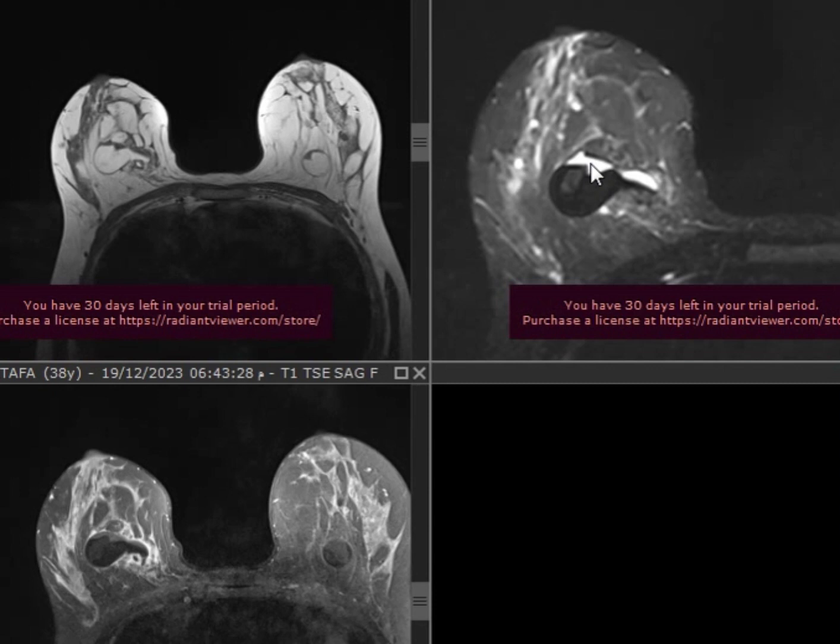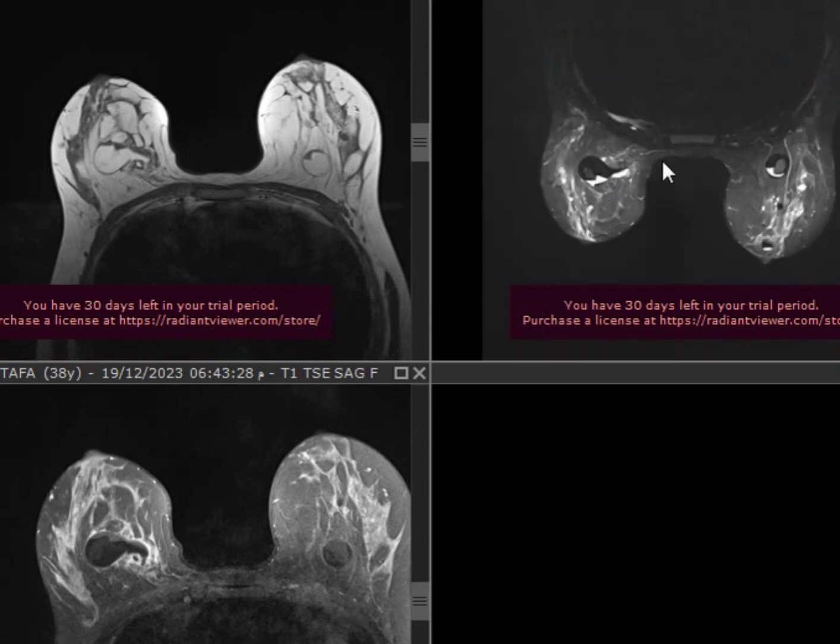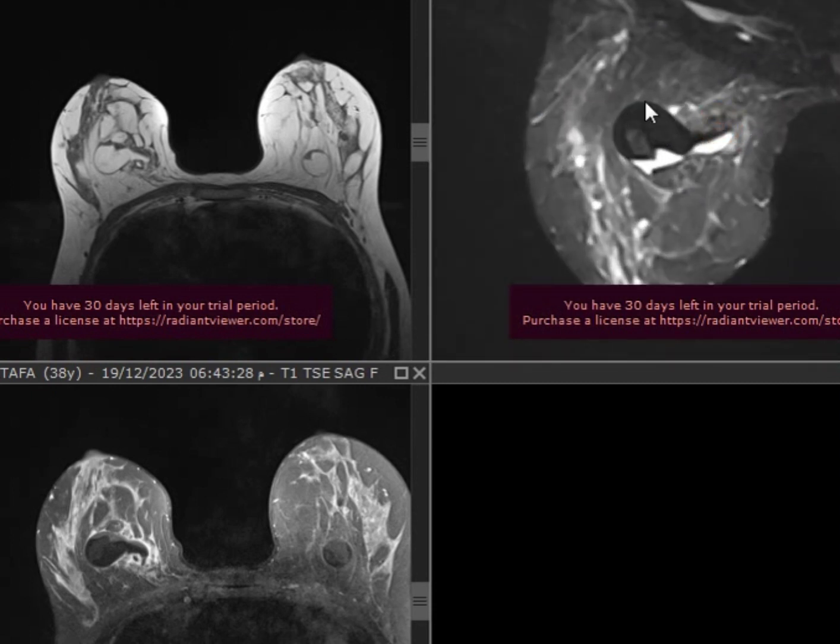By show of hands, anybody has any idea? In a fat fluid level, when we put fat on water, which one floats? Fat. Now, which one is floating here? Fluid. This is against physics. Exactly. The patient is prone. The patient on the breast MRI is prone, so this is up and this is down. To be more precise, the patient is like that. The fat is floating on the surface of the fluid, but you see the images flat.